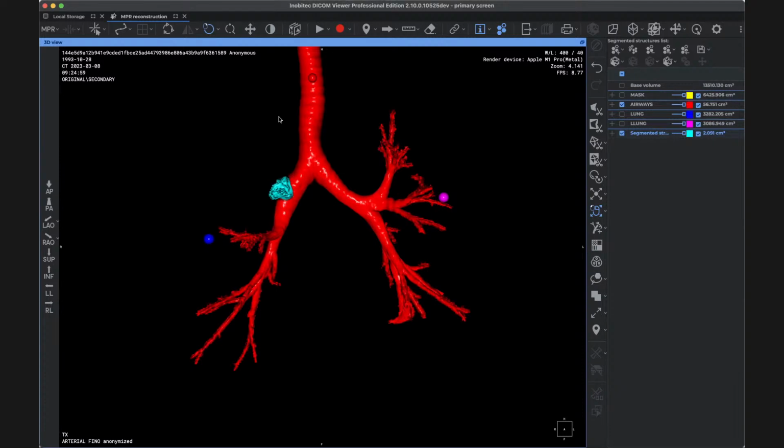Great. And thanks for the explanation about the vessels. It depends on the intensity of the contrast and the quality of the exam. I usually put a ROI inside the vessel to see how many Hounsfield units it gives me, so I can have a range which I can use when I select the mask. Okay, so first you measure on the 2D images, then you go to the dialog of the settings and just input the value. Yes. Thanks for your explanation. That's clear now.